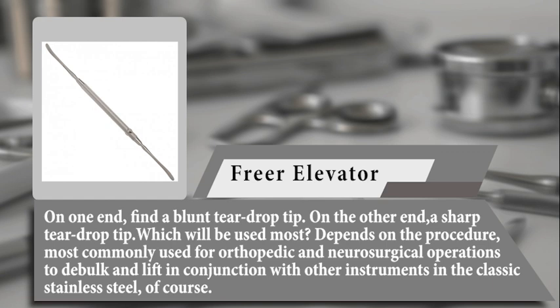On the other end, a sharp teardrop tip. Which will be used most? Depends on the procedure. Most commonly used for orthopedic and neurosurgical operations to debulk and lift in conjunction with other instruments, in the classic stainless steel, of course.